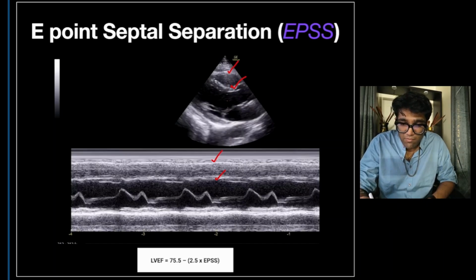Then we see the mitral valve leaflet. Okay. So this is the mitral valve leaflet silhouette. And then finally we see the posterior wall of the LA and LV. So this will be the posterior wall of the LV actually, base of the LV. So once you've got your orientation correct, these structures are then plotted against time.